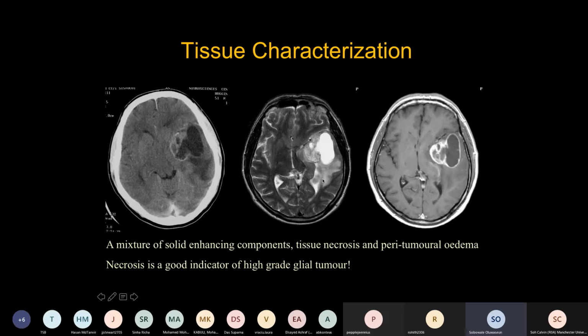So in the olden days, where people used to biopsy for this lesion, we find that beyond the enhancing lesion, all the areas of so-called edema on histology show that actually it is due to tumor infiltration. So you can't really tell it's pure edema. Okay. Things with necrosis in it that look ugly in an older patient tend to be GBM, but metastasis and radiation necrosis can occasionally look exactly the same.